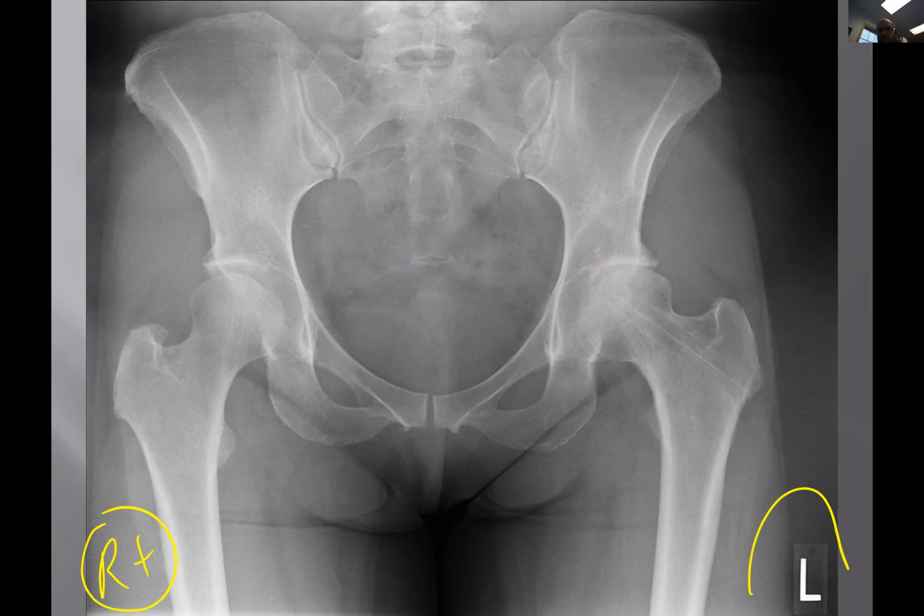Reduction of the joint space and supraacetabular sclerosis. Okay. Sclerosis. Yeah. Good. So if you look at this case, pretty good joint space in the superior compartment, but on the left side, I agree. I mean, look at that. There's pretty good narrowing of the hip there. So this obviously degenerative joint disease of the hip can cause pain. Now, I bet you're seeing something else though, right?